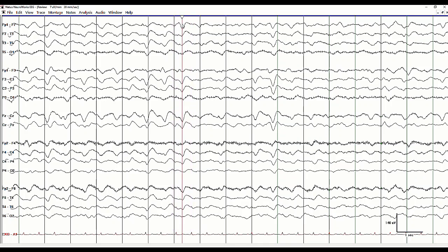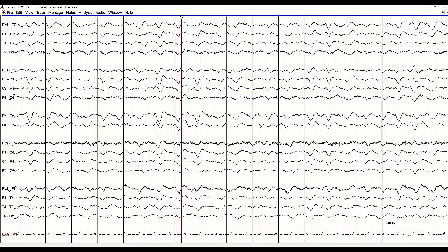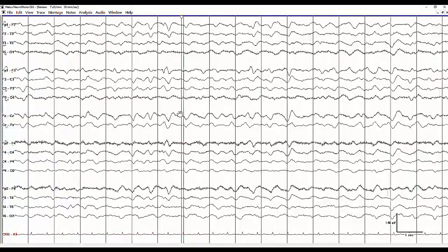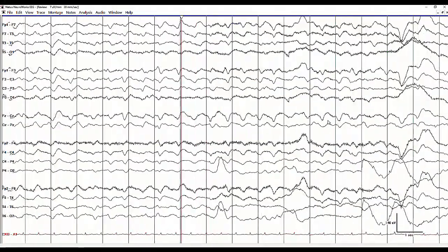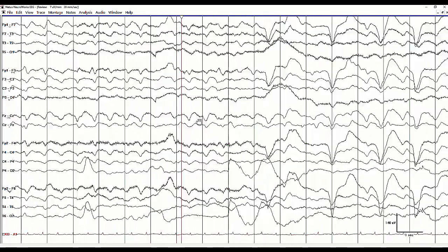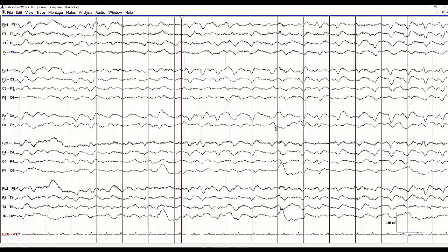So the classical clinical condition associated with GPDs that have that triphasic morphology is going to be hepatic issues, or issues with the liver, but really technically etiologically non-specific, but they do point to a metabolic encephalopathy. There's something metabolically abnormal or unsettled with the body.